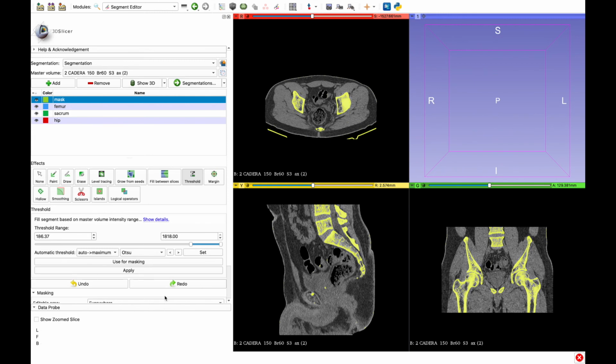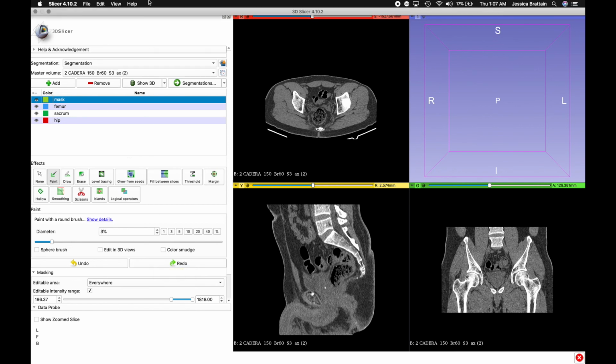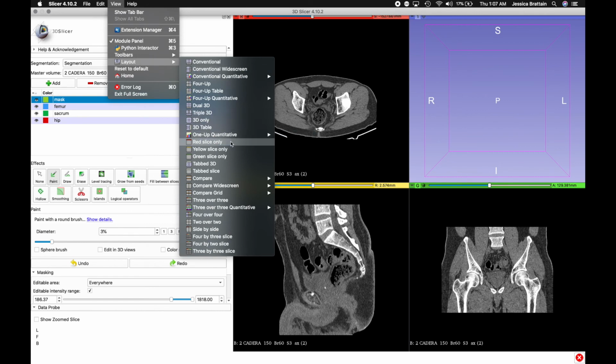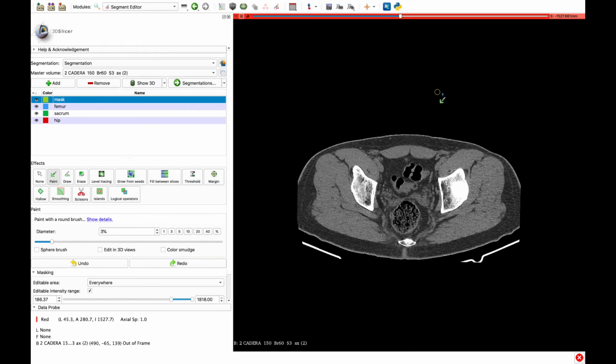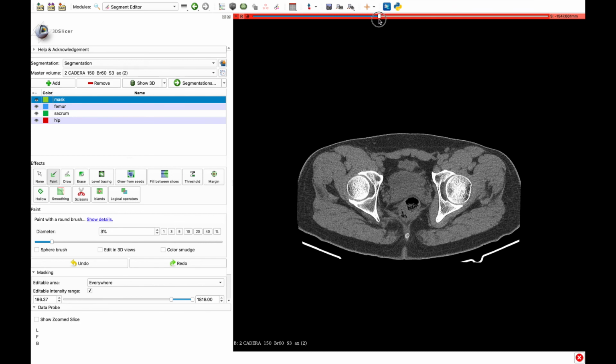So yeah, you just want to make sure all the bone segments are seen. Now we're going to use it for a mask. Alright. And we're just going to change the view just to make things a little bit easier. You go up to the top, and there's a view option. Here's the first segment, the red segment. And there's a scroll bar at the top. You're going to scroll through it until you see a view that looks nice. That one looks pretty good.